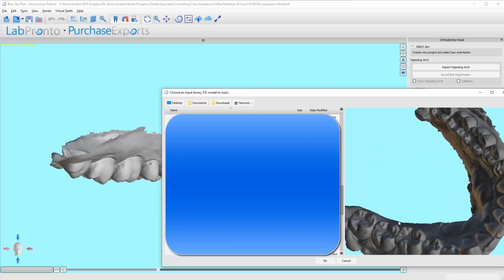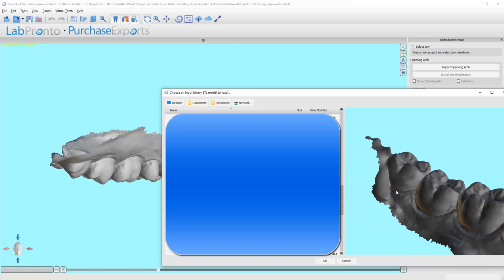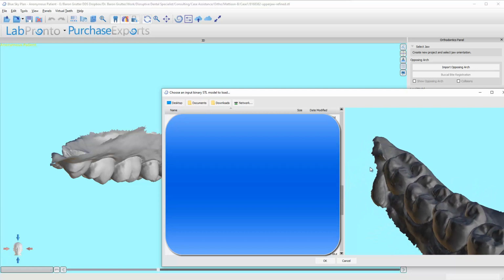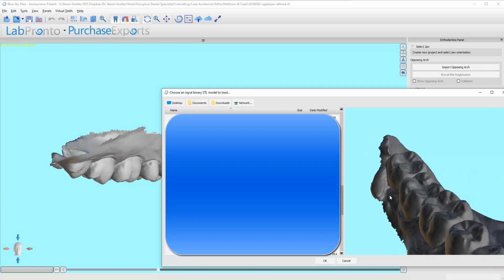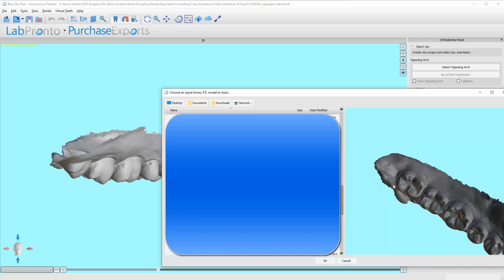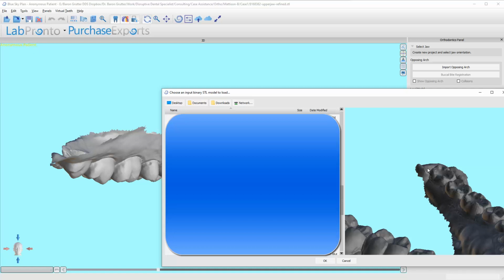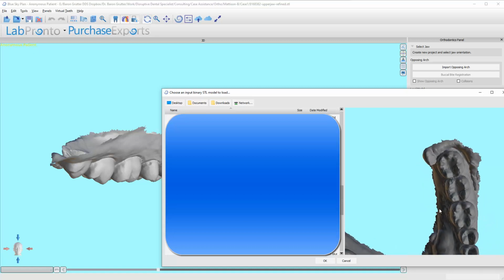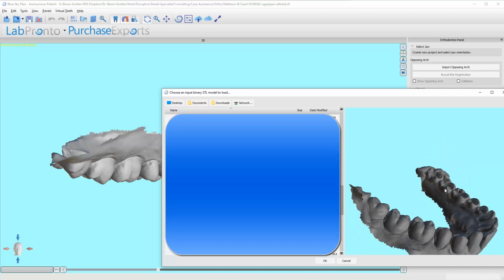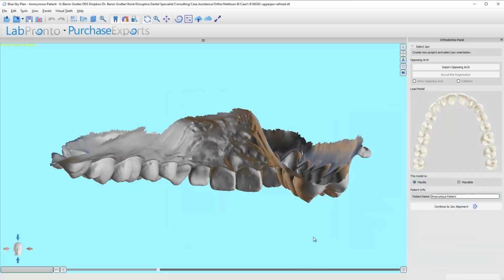There are areas where it would be nice if this tissue hadn't lapped over the buccal surface, because I don't think that's just where the patient is. I think this is the cheek hitting it, because the gingival margin is too abruptly vertical here. So I'm pretty sure a little more time scanning this would be nice. Same thing right back here. But again, these are third molars. We'll manage. Okay, so I'm going to click OK.